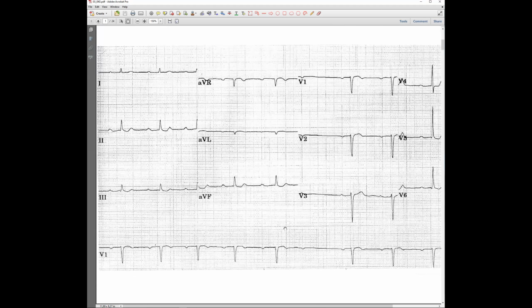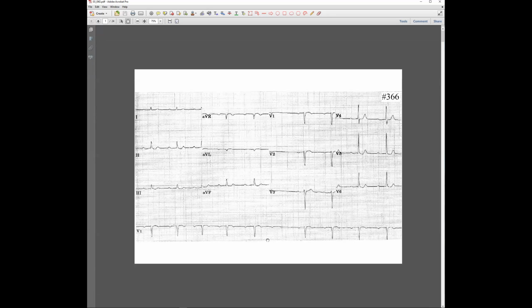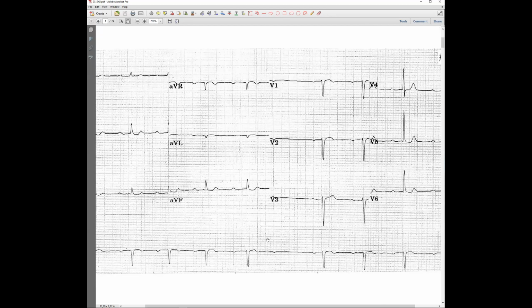What was the heart rate? Since you say it's not rhythmic, that's why I have to calculate. I can't really tell whether the box indicates a second. If you do not have rhythmicity, you have to count a longer interval, okay?